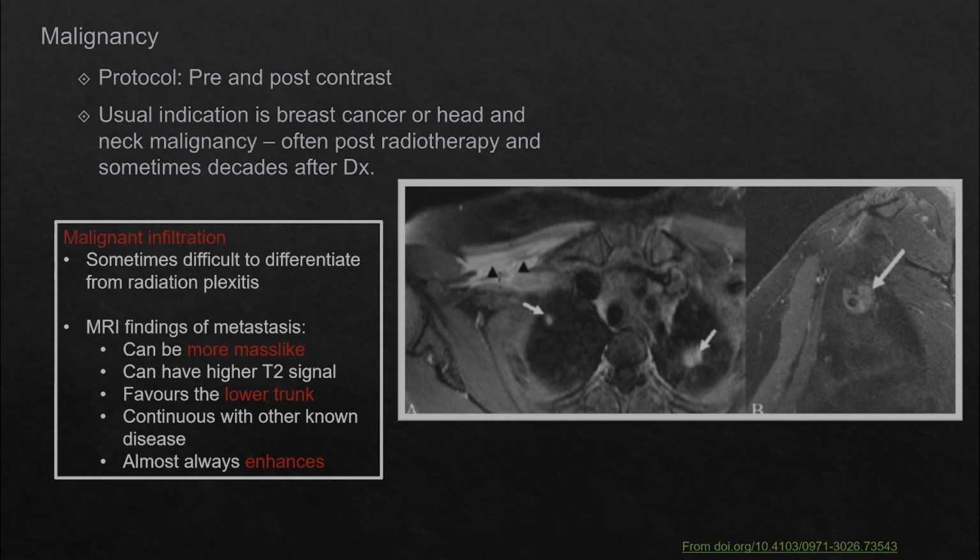Here you can see, especially on the sagittal images, soft tissue encompassing the whole of the brachial plexus, with the subclavian artery shown as a signal void within. And in the lung apex, you can see a further small new metastasis.